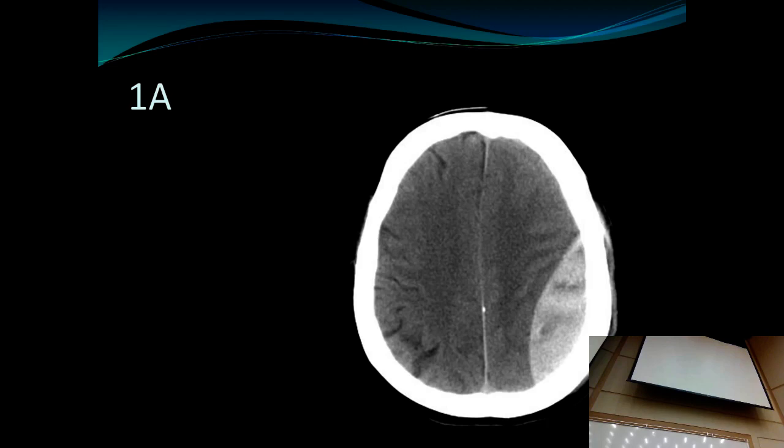Yes? I'm guessing subdural because it looks like it's underneath the, I'm forgetting that word, underneath whatever. And it's really big and crescent shaped. Okay. Can be hard to tell, but in general, if you see something wedging into the brain, it's an epidural. Subdural hematomas tend to layer out along the entire surface of the brain. They don't wedge into the brain like that. So this is an epidural hematoma.